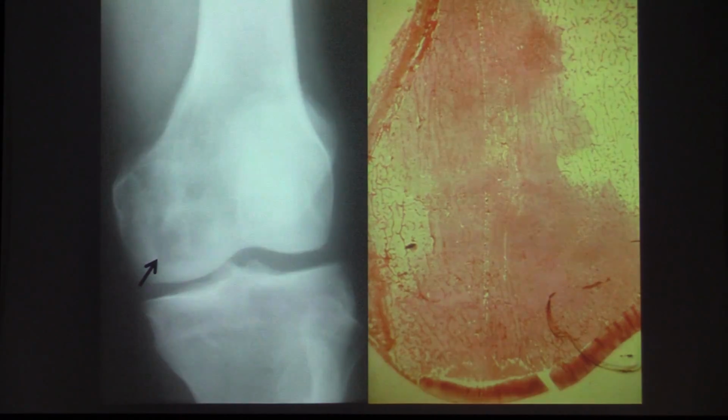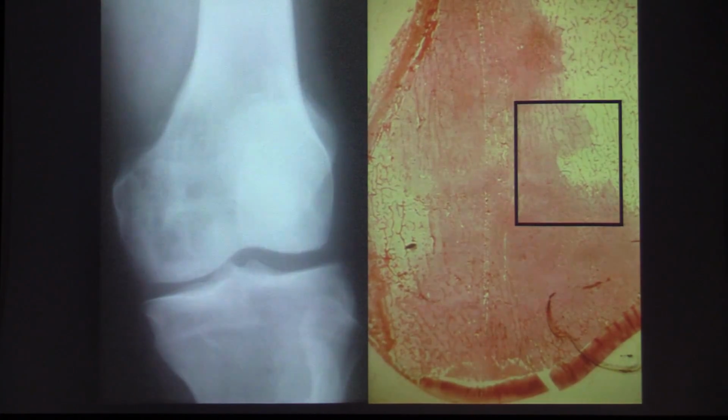And we always classify lesions by their most aggressive pattern of osteolysis, and you can say, well, maybe that's well-defined, not sclerotic, but certainly the majority of the lesion has this ill-defined border, and if we look at the macroscopic section, we can see exactly why. We can see that the tumor is growing fast enough that it's encasing the host trabeculae before the host osteoclasts can remove it, while in other areas they're partially removed, and other areas they're completely removed. Again, it's the combination of all of these that give us that geographic ill-defined margin in this fibrosarcoma.